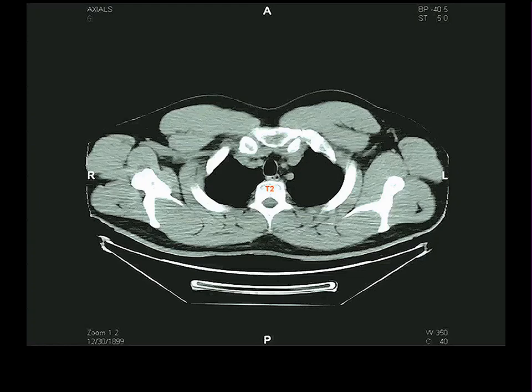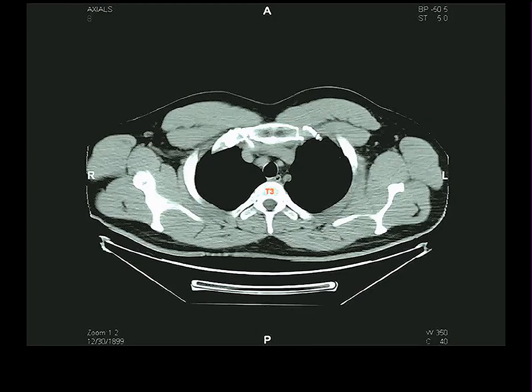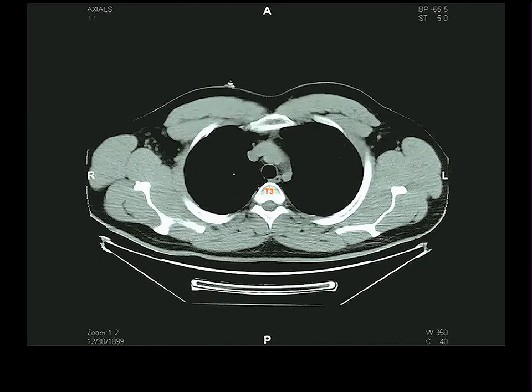So then we see we're in the middle of the manubrium here, first rib going down, continuing to go down. The manubrium's getting bigger. The clavicle is gone on the left side, but you get the very tip of it on the right side. Now both first ribs are joining the middle of the manubrium, and their costal cartilages are. And the second ribs have left, wrapping their way around. And we keep on going down and down. Now we have the third vertebra and the third rib.